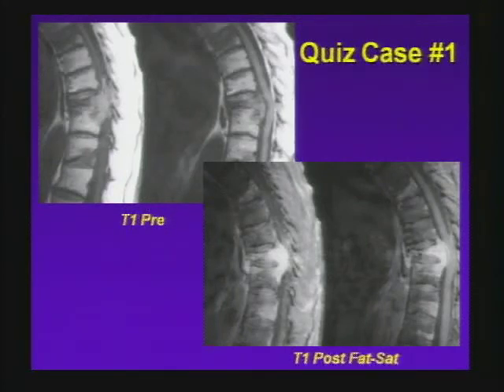All right, well, you're all committed on paper now, and I think the important features of this case are as follows. Certainly, there's more than one lesion, and if you find more than one lesion, you've got to think about metastatic disease. There's another lesion up here. With infection, it tends to be mostly centered around that one disc that has the discitis, or maybe 2 vertebrae, 1 disc. When you give the gadolinium, there's some epidural enhancement, but it pretty much matches the tumor in the epidural space. You don't have the anterior longitudinal ligament enhancing all the way up to the skull base.